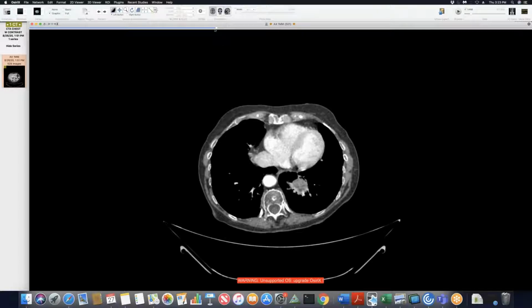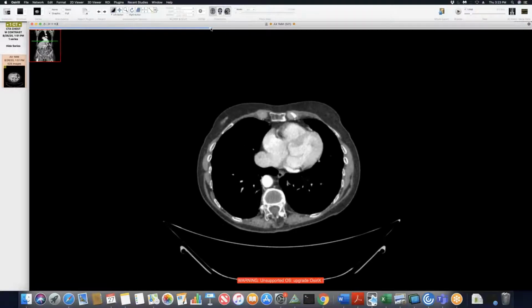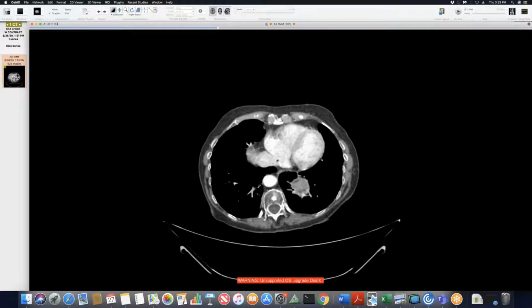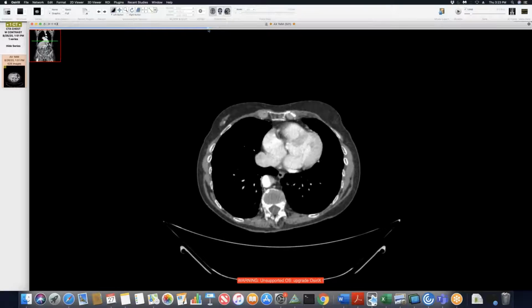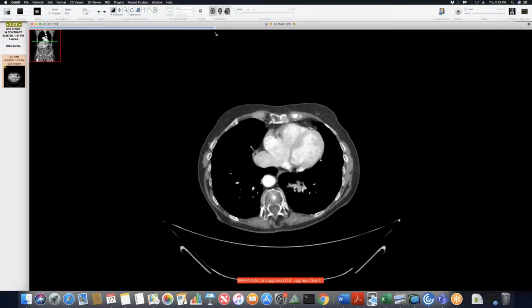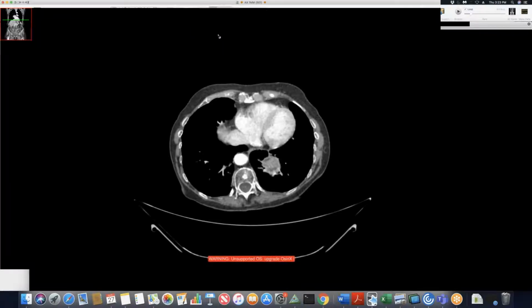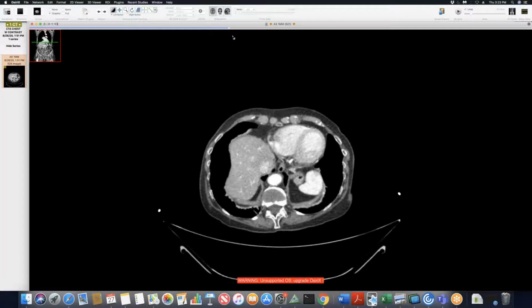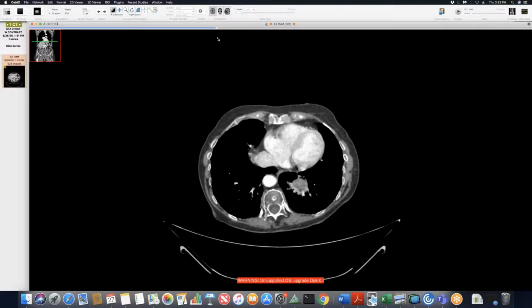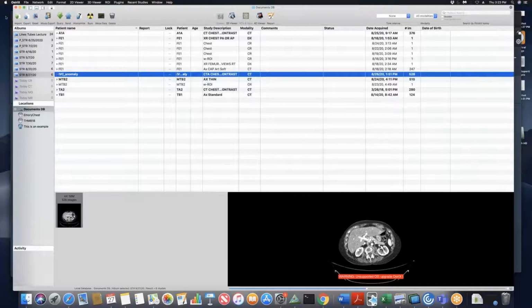There's the coronary sinus. So it's like the IVC, that vein, and the coronary sinus are all sort of connected to form seemingly one little bulbous structure. Is that it? Yeah, exactly. Yep. Okay. Oh, very nice.